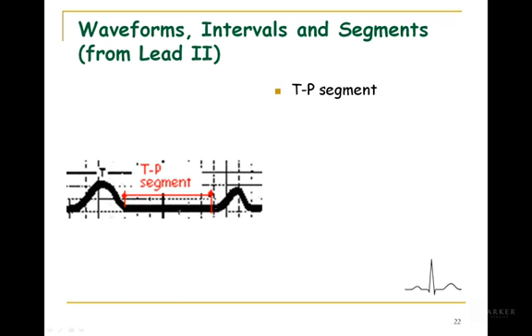But you're also going to allow a variation, just like the ST segment, of a millimeter above or below the J point. When we look at myocardial injury and ischemia, in lecture I'll be discussing why you want to look at that particular segment more than the ST segment to evaluate if there's any current flowing in the heart when it should not be.